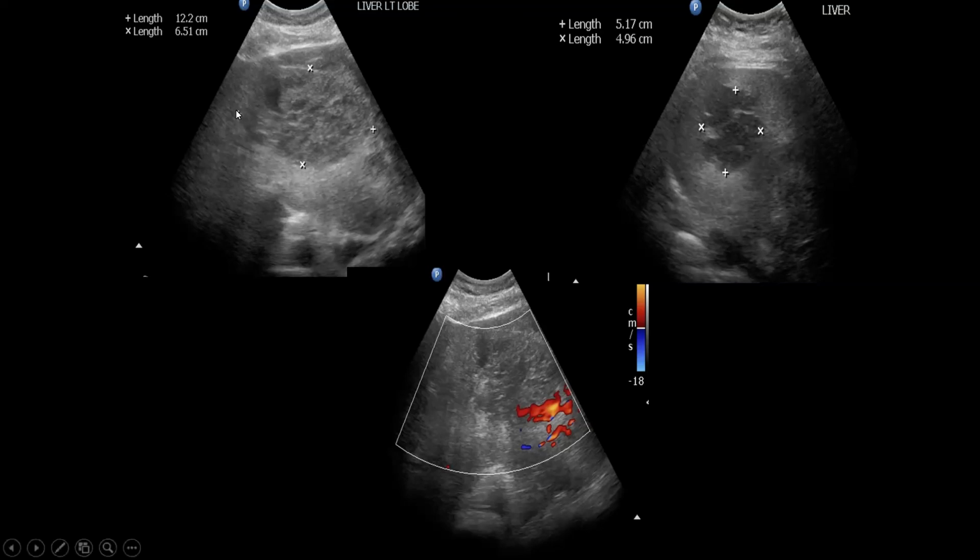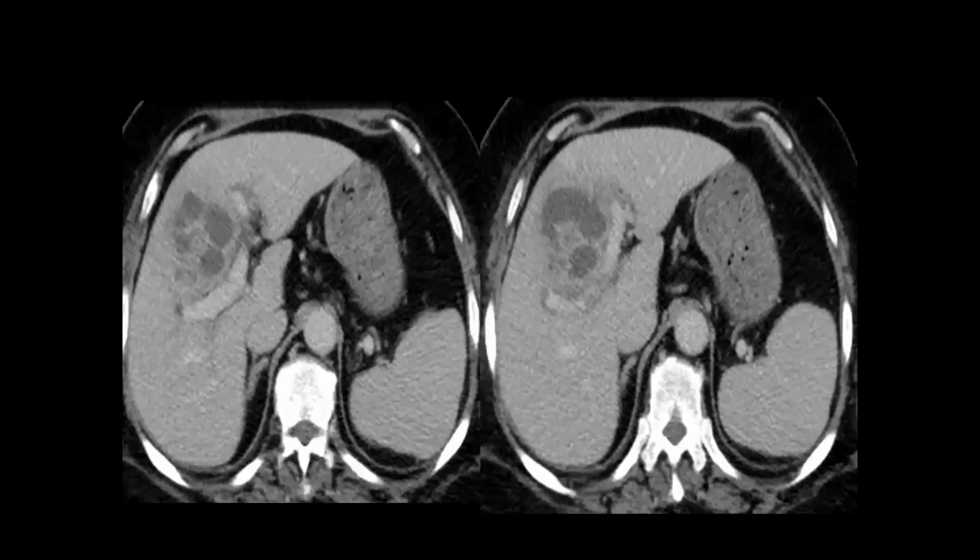Okay, so back to liver abscess. They usually start with a solid-like appearance, and then they can have small liquefied locules that can coalesce together with time and form a larger cavity. In the initial stages of liver abscess, it can be confused with masses like metastasis or cholangiocarcinoma because they look solid.